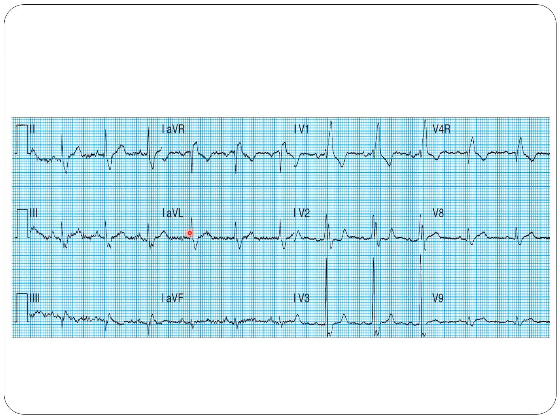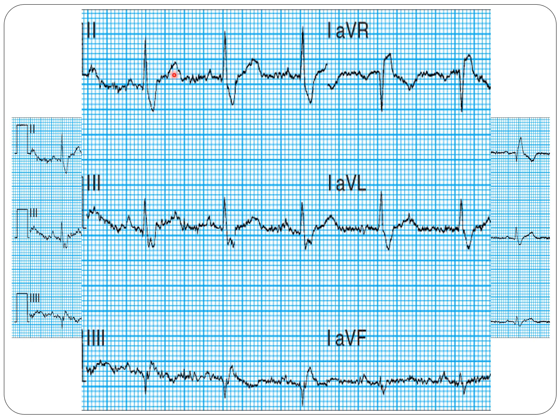And the next, we see rhythmic heartbeats. The rate is around 1, 2, 3, 4, 75. We see P wave, about the same, normal. PR interval is normal. Width of the QRS is wide. The axis is around 1 positive. AVF is actually about 0.